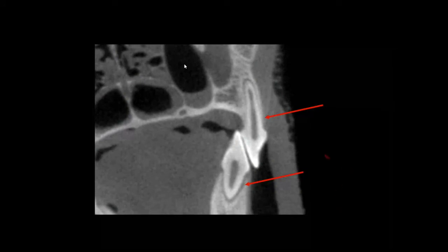When we look at a cross-section of this particular patient, this dog, we have to recognize what is normal. And we'll spend a bit more time in just a moment to recognize what normal should be. Here we see bone level on the buccal lingual aspect, something that we're not used to seeing in 2-dimensional radiography because we look at projections. So this is buccal, this is palatal or lingual.